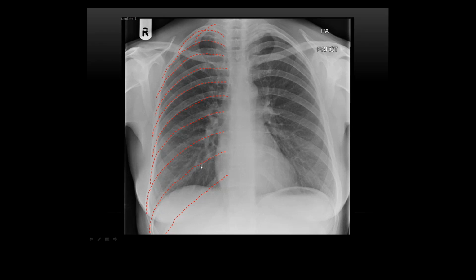But the theory behind that is when you look at a chest X-ray in this standard orientation, your eyes are just tuned into looking at the heart and the medial side of the lungs. They're not really tuned into looking at the bones. But when they spin it round, it throws your image interpretation off, so you can concentrate on a certain area. So by turning it on its side, it does help some people. Sometimes it doesn't work for some people, but just try it, see if it works for you. But again, you might get some weird looks if you're looking at a chest X-ray on the board like that.